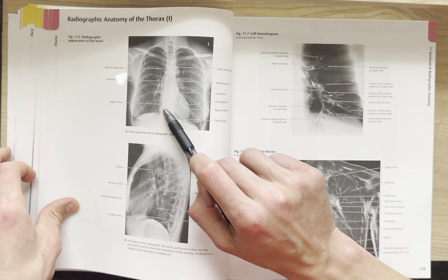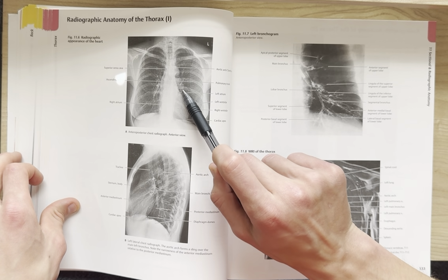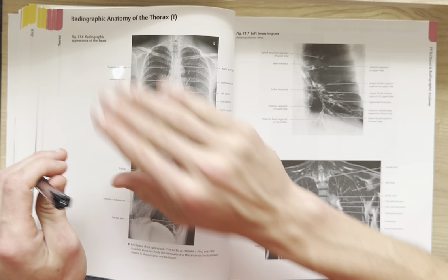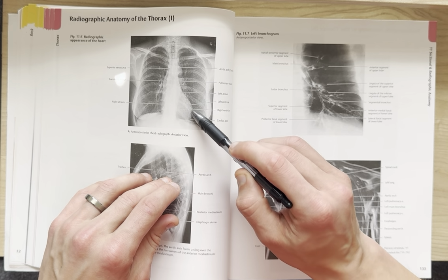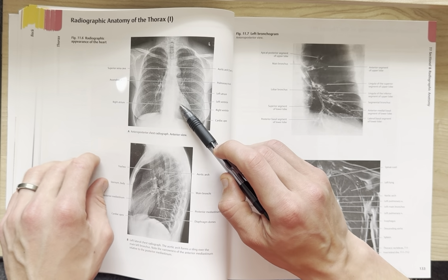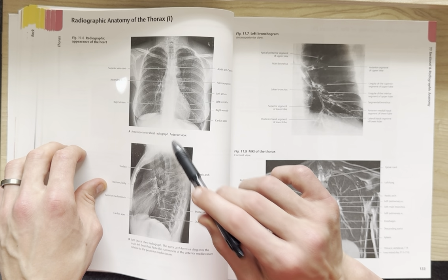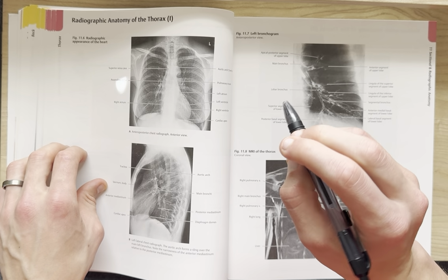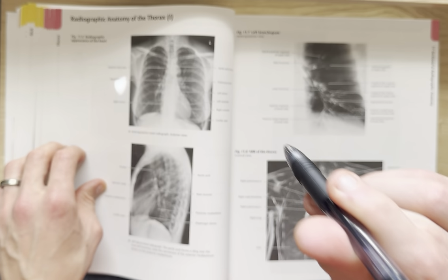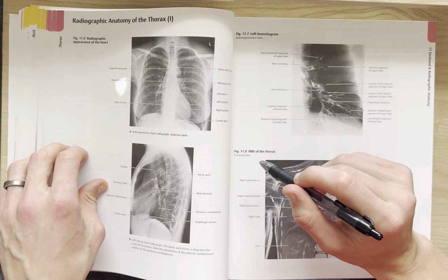Here is your right atrium, your right ventricle, your left ventricle, and your left atrium, because again, the orientation of the heart is not straight up and down. Thorax is down here. And here's your left ventricle, of course. So it says anterior, posterior chest radiograph, anterior view. So it's an anterior view, and the X-ray was done with the radiation of the X-ray going from anterior to posterior through our patient.